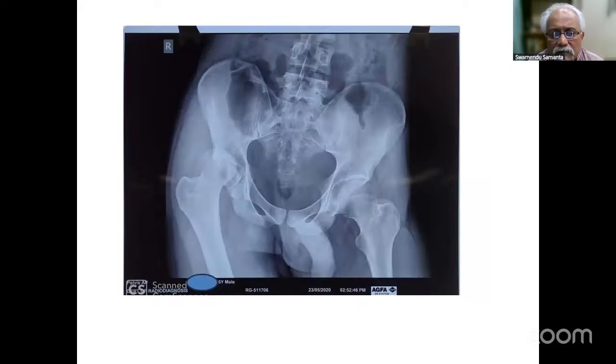Then suppose you get this sort of X-ray. Anybody? Someone else, I think, because we'll be giving very common X-rays. Then we'll gradually go into the different subjects of radiology. Okay, so Vansu has also joined. Prashanjit, you start, you can continue. It is similar to the previous one.